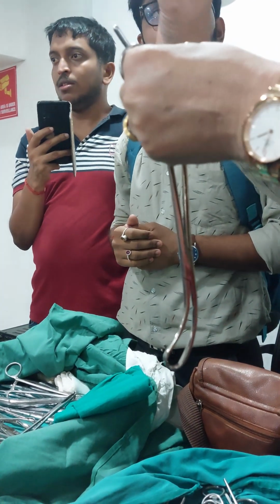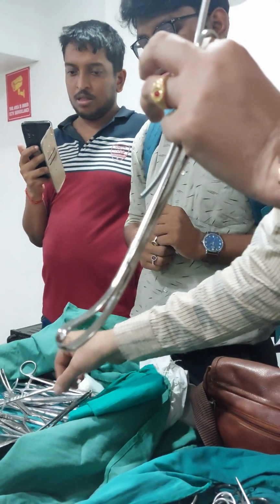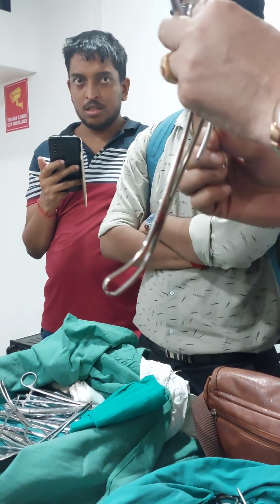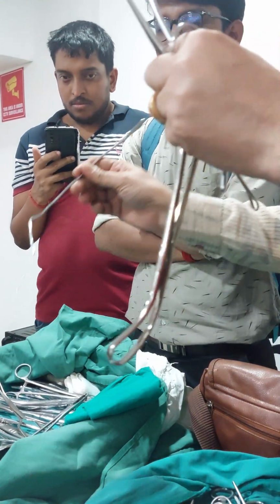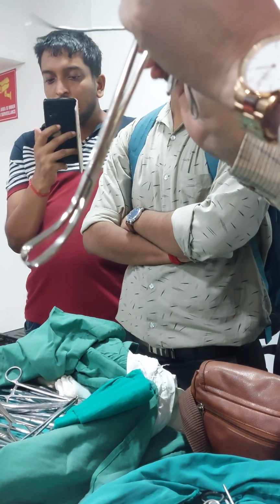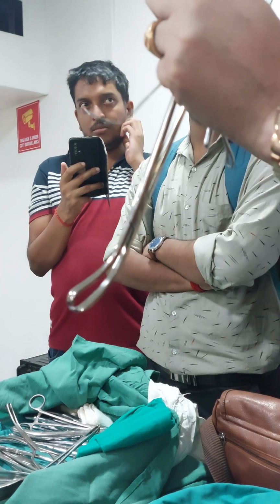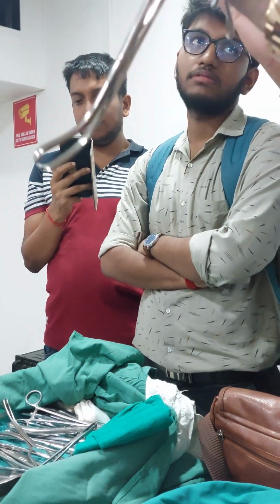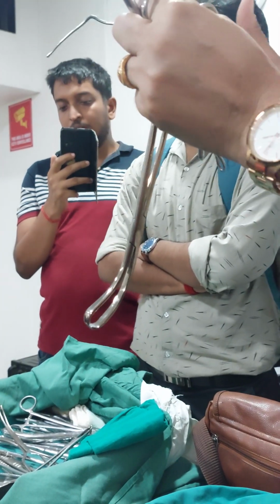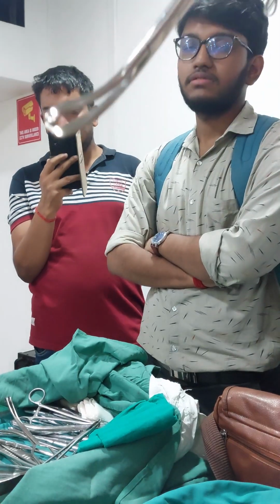Cervical canal, this is introduced to enlarge the cervical canal so that I can introduce the instruments. Because the cervical canal is very narrow, you cannot pass anything except the sound. Sometimes the sound also cannot be introduced. Suppose the patient has had a cesarean, then the cervical canal will be very narrow. After a normal delivery the cervical canal remains a little dilated, but after a cesarean even introducing the sound is extremely difficult.